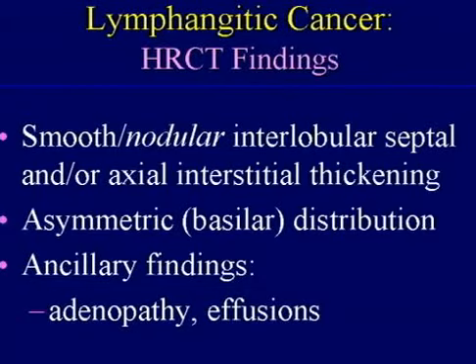So very briefly, one of the key characteristics is that now you do pick out the secondary lobules because the lymphatics in them get all clogged up with tumor. And when they get clogged up, you start to see them. They can be either smooth or nodular, more frequently nodular. And it really does in its own right distinguish it from most cases of sarcoid. It's asymmetric, it's basilar because it's hematogenous. As you know, lymphangitic cancer is hematogenous, so the stuff goes down, not up. And then effusions, and by the way, the patient has cancer.